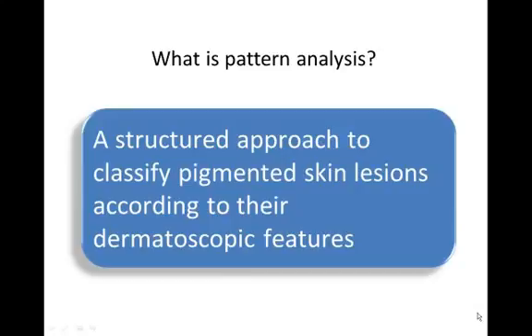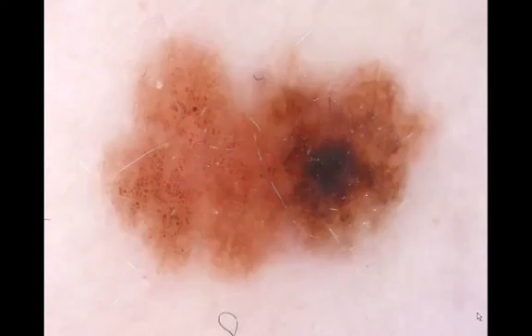This is the second part of Terminology Made Simple. We will use pattern analysis to describe the objects that we see with dermatoscopy. Pattern analysis is simple and consistent and uses a simple language. This is a lesion, to be specific a melanoma, viewed with dermatoscopy.